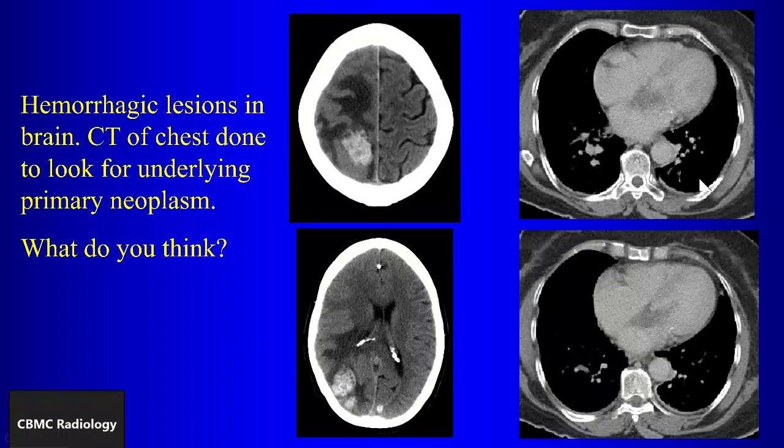Yeah, so here, there is this area here, right? So it might make you think of something. So what will we think about here? Myxoma, papillary fibroelastoma. Well, does papillary fibroelastoma attach itself to the interatrial septum? No. Also, you might think about thrombus, right?